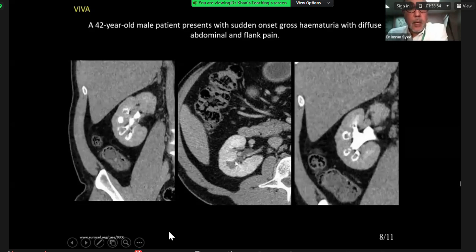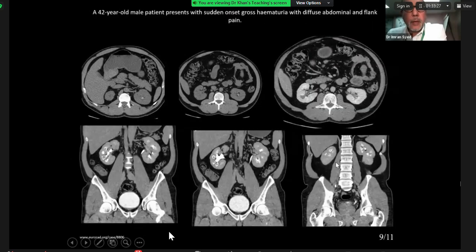This is an example of a completely clubbed and effaced medulla, because it's just this back pressure from the collecting system which has pushed this out. You've got very little contrast. You can only see the contrast on the sides. Can you see that? Yeah. So this is complete effacement, and where you've got partial effacement centrally, the contrast then fills in the rest of the space, and you get this sort of signet ring appearance that you've got there.